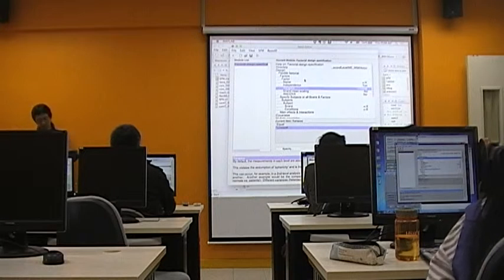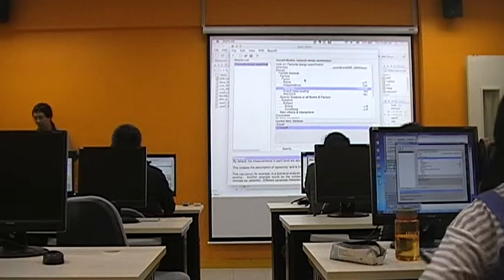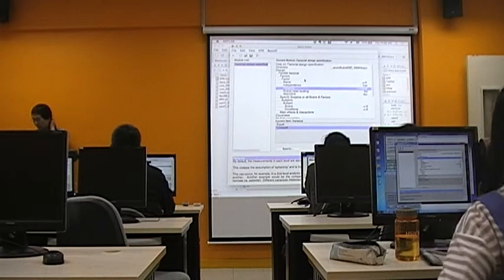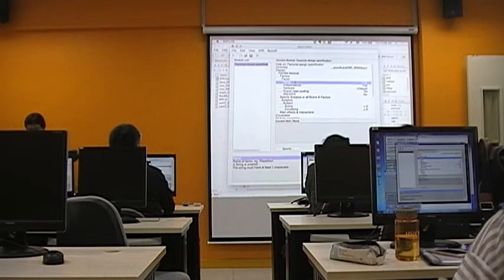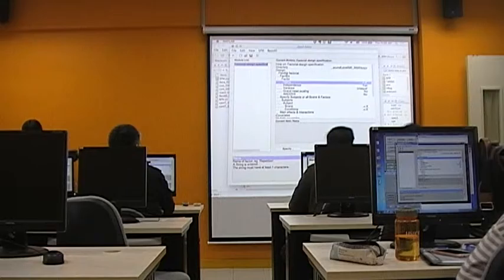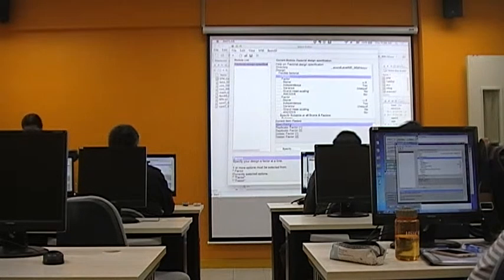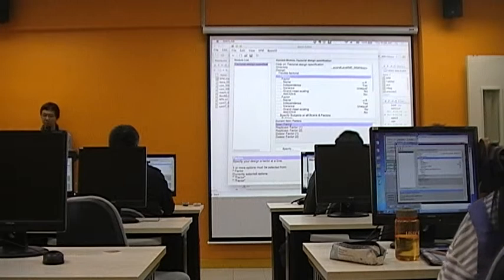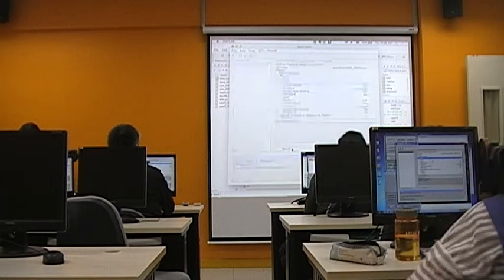I just want to quickly go through it once, but I think we don't have the chance to really run a model. So anyway, you just need to define a name of the factor. Every time you click on here, flexible factorial design, you could add some more factors. Normally we will have the subject factor as well as the experimental factor. So let's say we give a name for working memory.